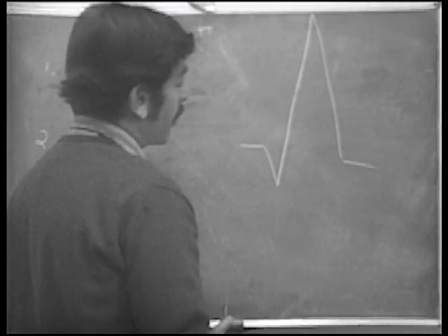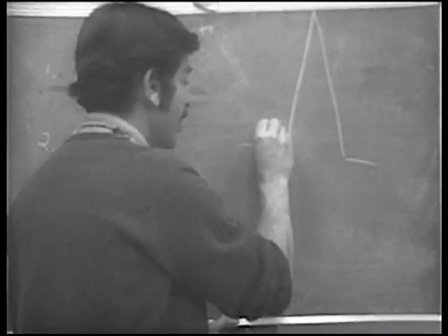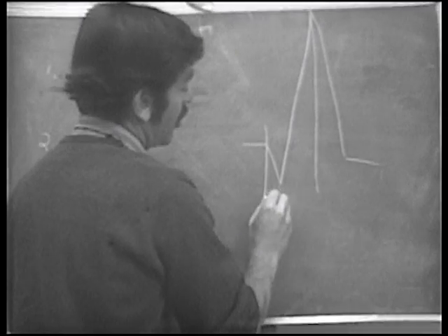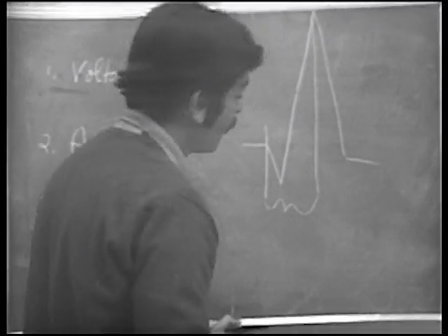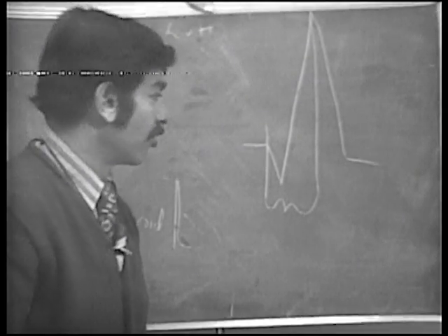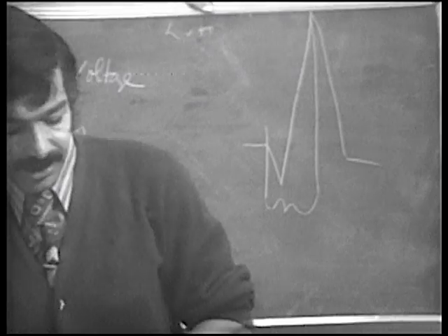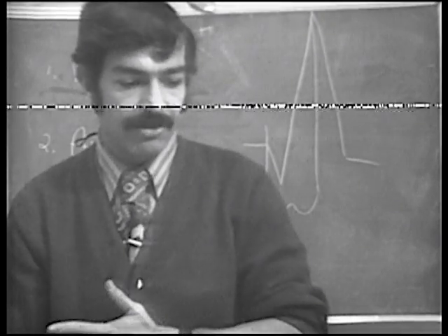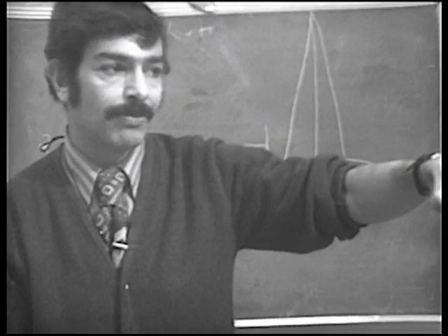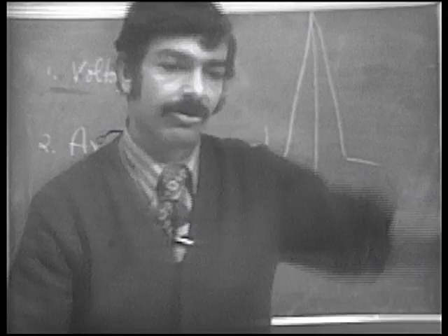So the intrinsicoid deflection, or the ventricular activation time, as it's sometimes called, goes from the onset of the QRS to the peak. That duration of time is the intrinsicoid deflection, or the ventricular activation time. And it supposedly is the time that it takes from the onset of activation until the vector loop comes out and sweeps by lead V6. And with thicker muscle, supposedly it takes longer.